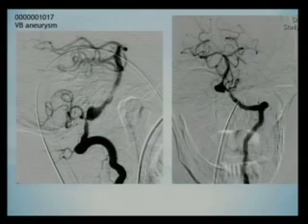Aneurysms are called giant when they're about 2.5 centimeters or larger, large if they're a centimeter or larger, and small if it's less than a centimeter. They normally look nice and round. If they look a little bit pointy like that, this is usually an indication that it has ruptured.